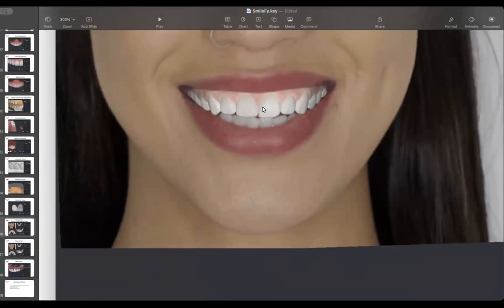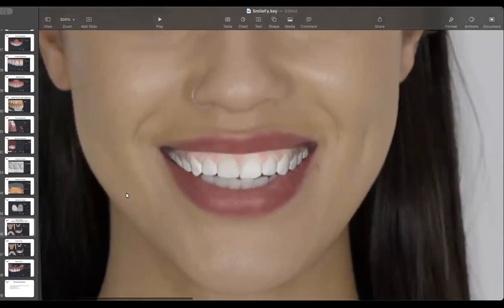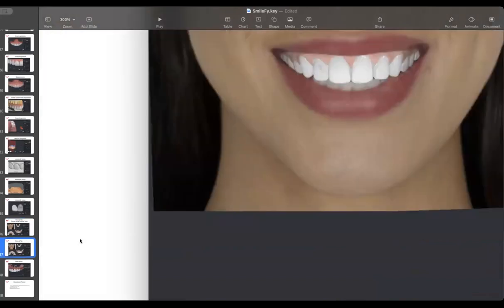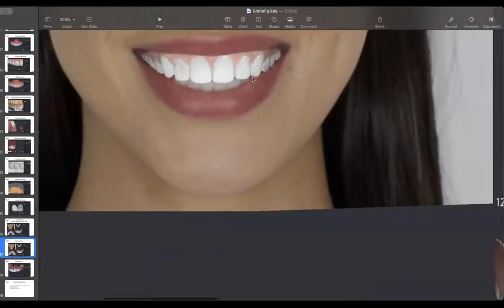And it is linked to her face, personality, genetics, everything. So instead of using some random templates on her, we clone her own smile, and we use her templates resized and in place to recreate the smile curve and to recreate her smile.